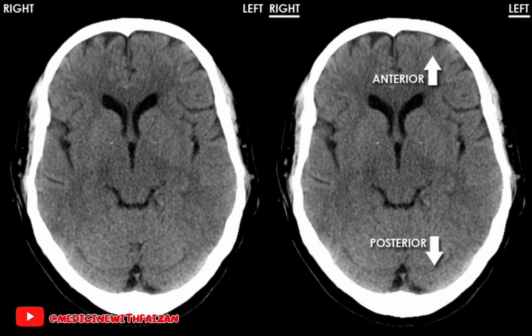In this lecture, we are going to discuss the basic anatomy of the brain on CT that will ultimately help us in recognizing brain pathologies, which we will learn in the later videos.